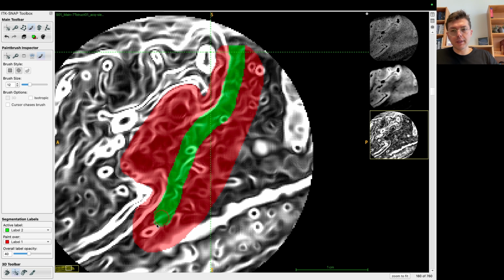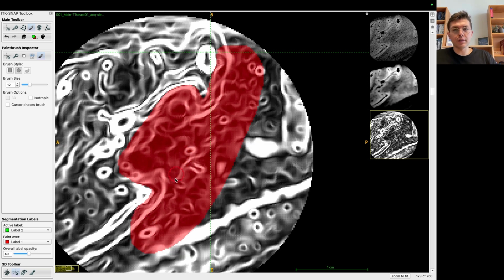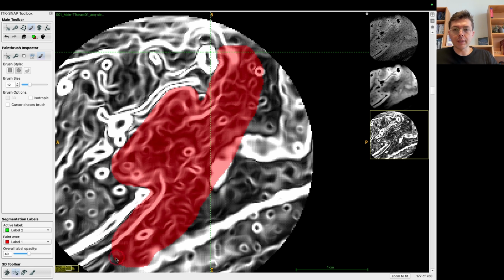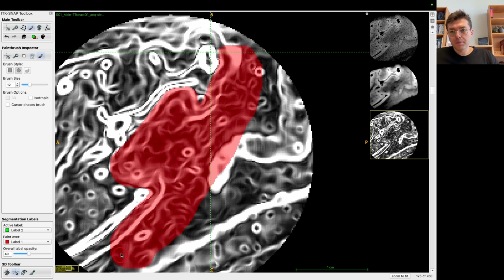In the really worst case, if we really cannot decide in some subjects this white matter gray matter boundary based on our T2 star weighted data, once we did this initial segmentation, let's say, and we put a note that in such and such subject I really couldn't see the white matter gray matter boundary for a large chunk of Heschl's gyrus, then we do T1 registration and figure the boundary out based on the T1 weighted contrast, but not before.